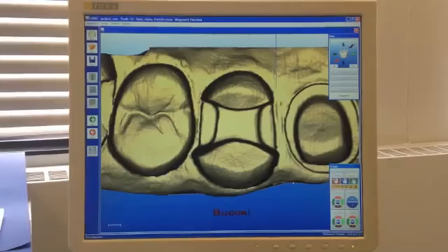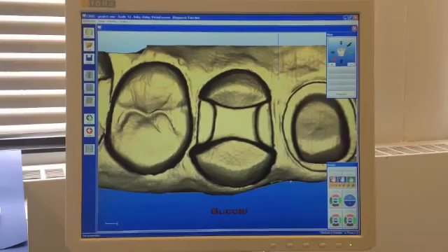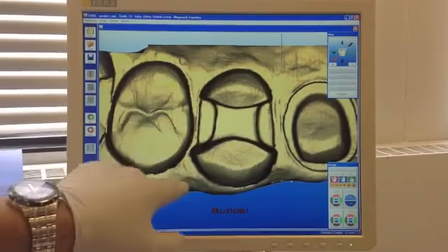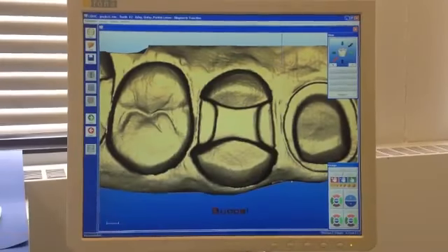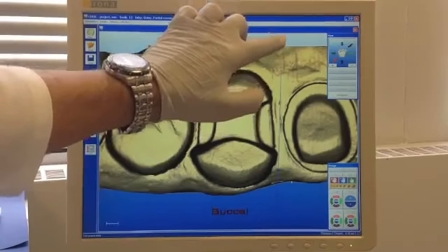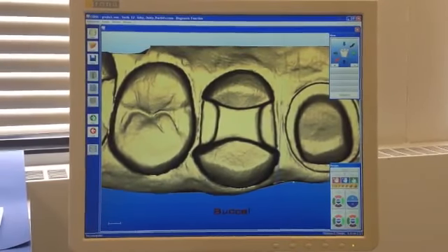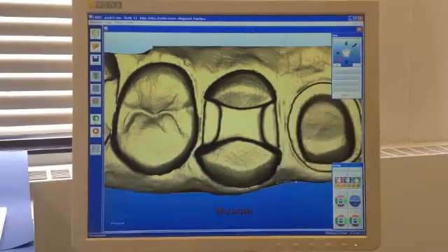Here we have a blue line that you can see and a white crosshair. Touch any area on the lingual or on the buccal, it doesn't matter where you want to start, and touch that particular area, double left click. Now we can see that we have a green line and a blue line. Just keep going, bring your mouse towards the proximal area, and you're going to contour the tooth. Make sure you remove the adjacent teeth.